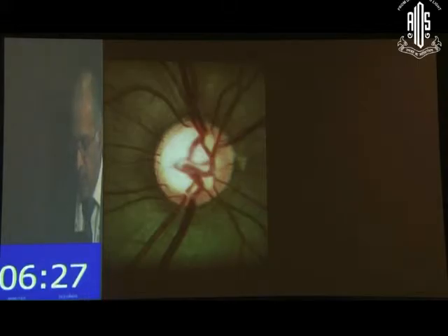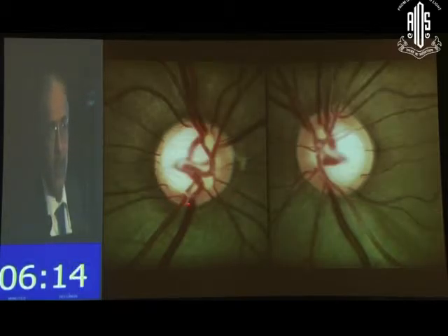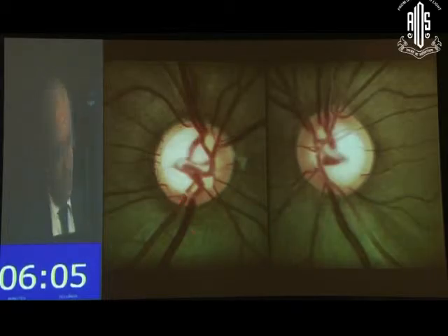Now look at the optic disc of the other side. Average size disc, inferior rim narrower than the superior rim, and the other positive finding is a nerve fiber layer defect. And when you see these two optic discs, same patient, you will obviously think in terms of glaucoma, right? But remember that when you saw one eye, you weren't very sure. The inferior rim asymmetry is again another telltale sign.